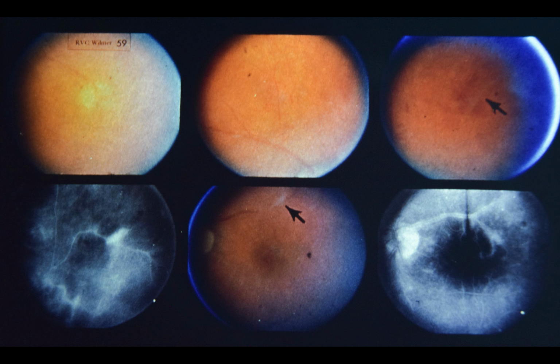Comment. This patient demonstrated physical signs of an inflammatory vasculitis and of a non-inflammatory occlusive vasculopathy. At the first examination, he appeared to have typical Eales disease. 1 month later, he had findings consistent with pars planitis. This patient's course suggests that these two entities may well be related, with idiopathic inflammation of retinal vessels as the common underlying feature.